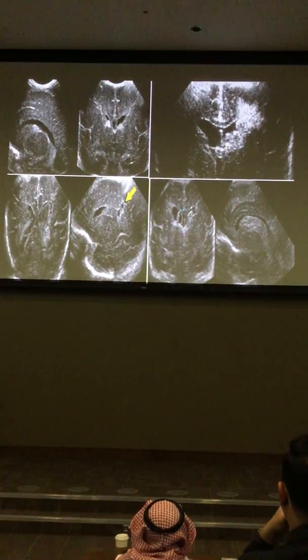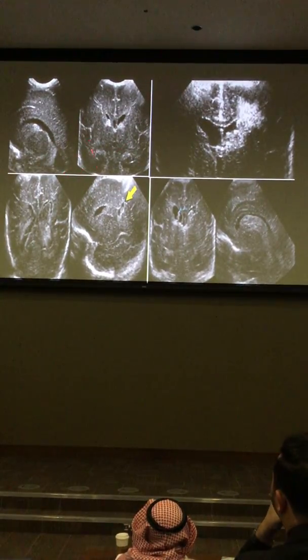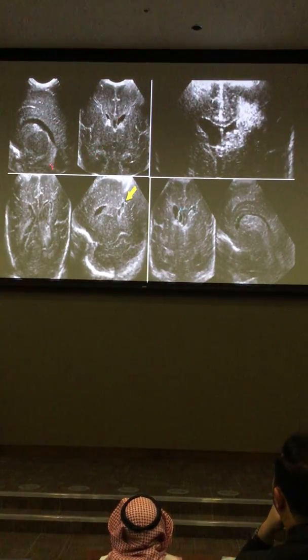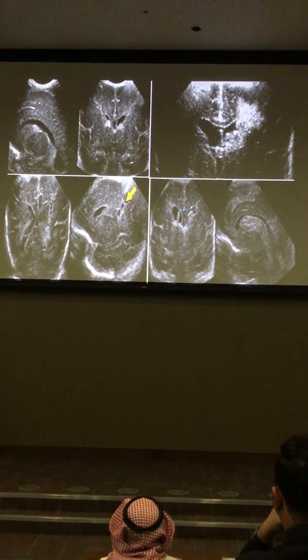Now, that's your test, your quiz. All babies have hemorrhage. So, which grade? Let's start with this one. Which grade? Grade 1, excellent. So with this one? 2. Probably it is.